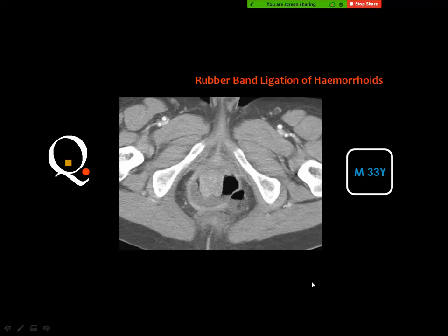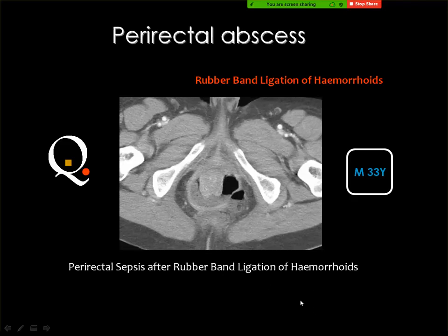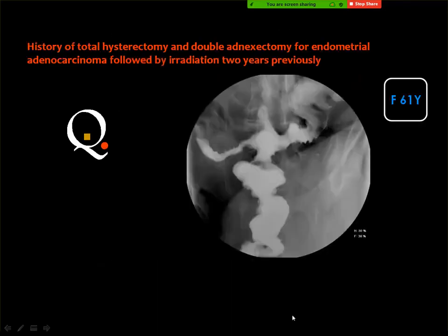Hernia. Rectal mass. Yes. This is the anal canal, and this is the ischioanal fossa. Then you see a collection that is marginally enhancing and contains air fluid level, diagnostic of abscess. Yes, and this is a perirectal abscess.